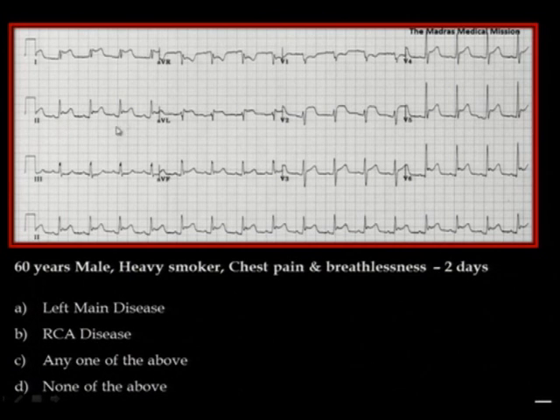As long as you have a concavity upward ST segment changes, no ST segment depression, and typically if this is associated with some notching, which is early repolarization sign, all is possible in a condition called acute pericarditis where the manifestations can be similar. So this is an acute pericarditis, very classical.